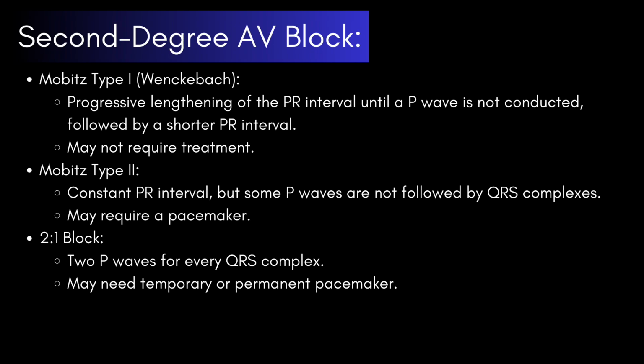Let's take a look at second-degree AV blocks. There are three major types of second-degree AV blocks, which I will go through one by one with you guys here, followed by some visual examples on the next slide.